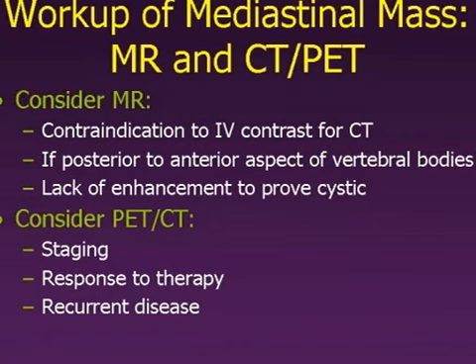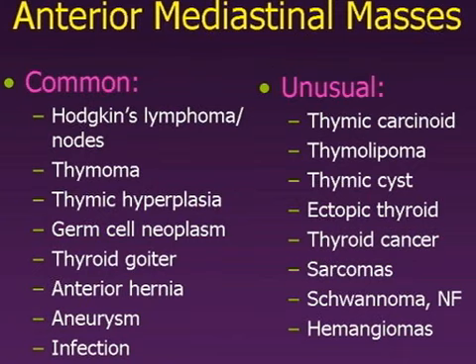PET-CT is obviously useful, as we've heard this afternoon, for staging of neoplasms and to assess response to therapy or the problematic scenario of recurrent disease. Sometimes this can be useful to differentiate inflammatory from non-inflammatory conditions, as well as outside the realm of malignancy. Many of the complicating processes in malignancy, however, including infection and radiation changes, as we saw, are going to be PET positive, so it may still be a bit problematic.